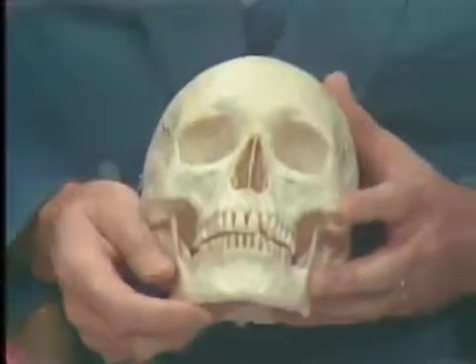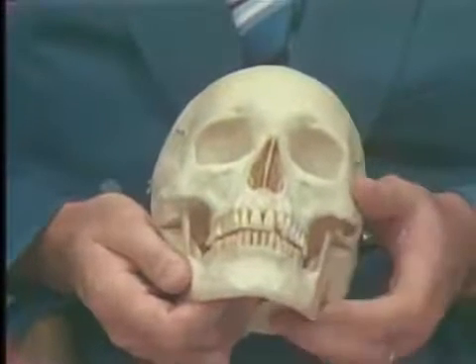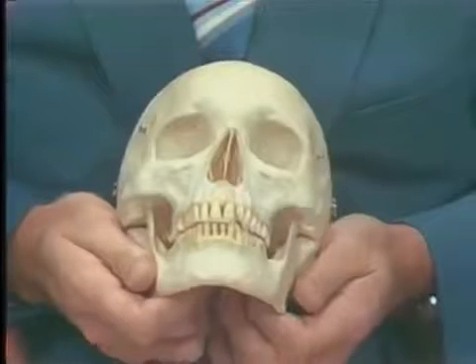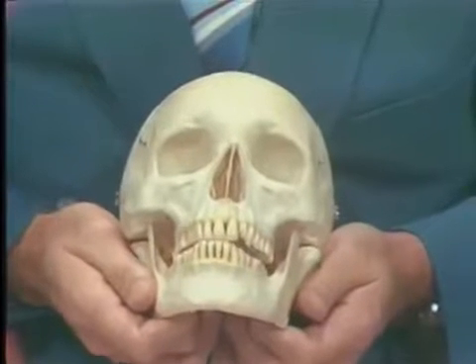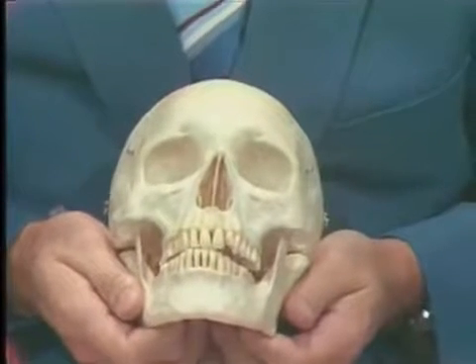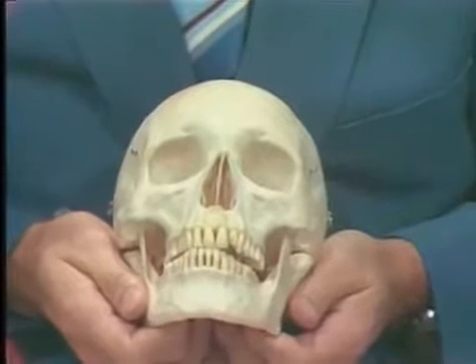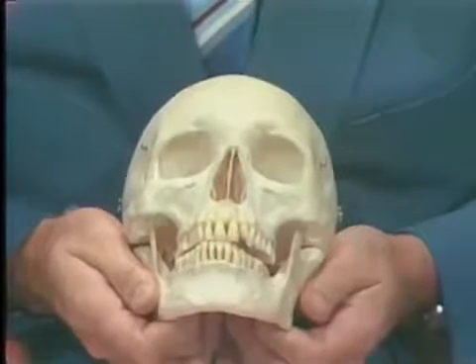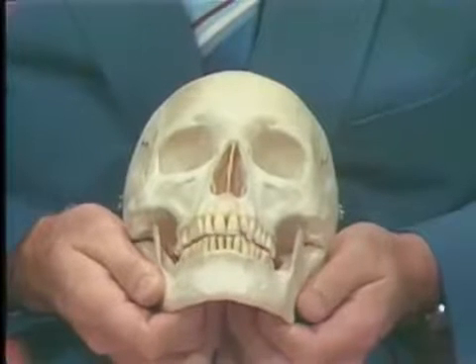And I'd like to demonstrate this in such a way that you might see that when you go into working, this would be right working, where we move out and the teeth would come into contact on the right side of the skull, which would be your left as you look at it now. Then we go back in.